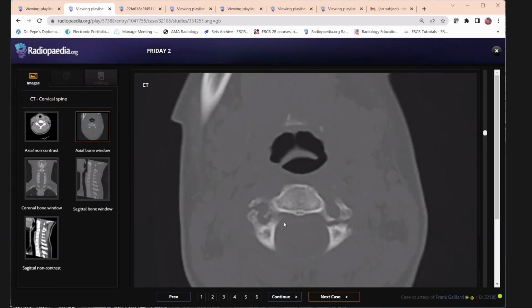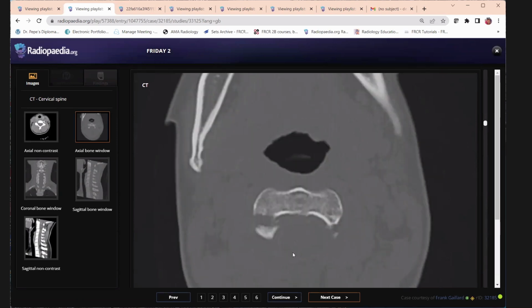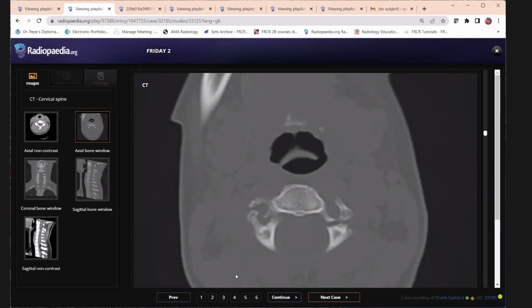Okay. And because this element is being impinged upon, you can always say that if the patient is going into surgery, if they want to look for ligamentous injury, then you will go for an MRI, because these patients won't wait. These are unstable fractures. They will immediately go to OT. MRI will take time to be done, right?